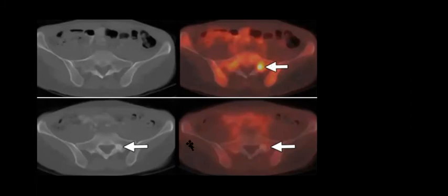Yeah, Hiba, perfect. So this is a very common scenario that you should be aware of. Some of these metastases can have remodeling, osteoblastic remodeling. And this is very tricky because when you just report this image in the CT, you will write it as newly developed metastasis. That's why, if you are aware of this scenario, in this case go and check the previous image. And sometimes even if you check the previous image and you didn't find it, sure you are going to say that it is a newly developed lesion.